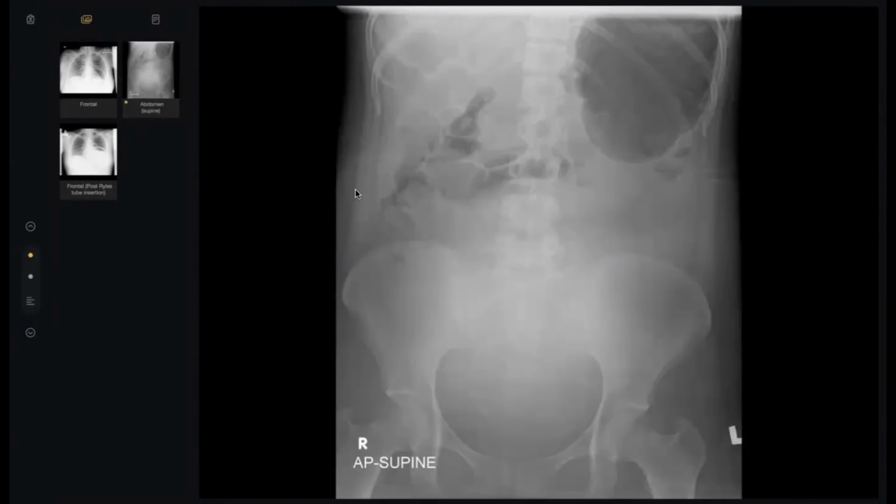The abdomen X-ray shows a well-defined lobulated lucent structure over the left upper quadrant, partially extending into the chest. Looking at the rest of the abdomen for signs of free air or collections, I'm not sure about pneumoperitoneum in the central and left part of the abdomen. Given the presentation, there is no abnormal bowel loop dilatation to suggest bowel obstruction.